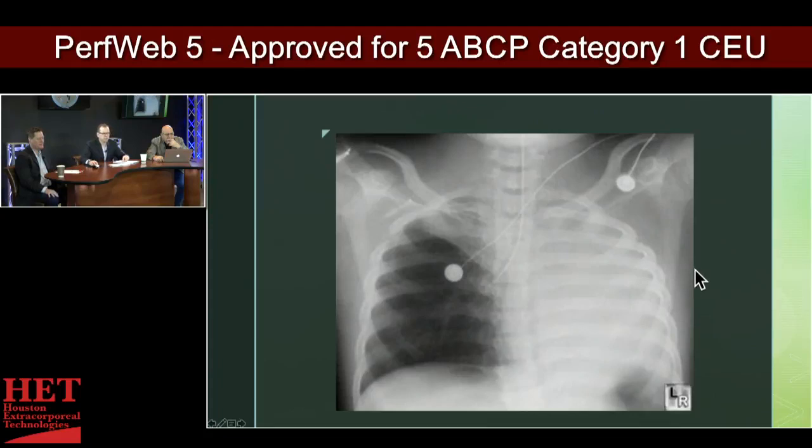Second verse, same as the first. What do you see here, Patrick? Is this a pediatric? This is an X-ray from posterior. All right. This is not something I can comment on. This looks crazy to me. So let's go through it the way we talked about bone structures. So bone structure to me looks completely... No, I don't see any fractures or anything, but it looks different to me. It looks like maybe I would guess this could be a posterior X-ray, maybe.